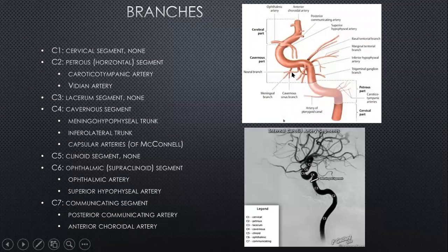But occasionally, especially when you have occlusions, AVMs, or you are embolizing a tumor or a fistula, that's where it's very, very important to identify these branches, not only because they may be supplying the abnormality, the tumor or the fistula, but also these are the potential anastomotic sites whereby some of the external carotid branches can plumb into these arteries and can be a source of problems, because most of the embolizations are done by the external carotid system for tumors or for fistulae. And if there is any artery which is communicating with the internal carotid artery, then these are potential risks of embolization into the leptomeningeal vessels.